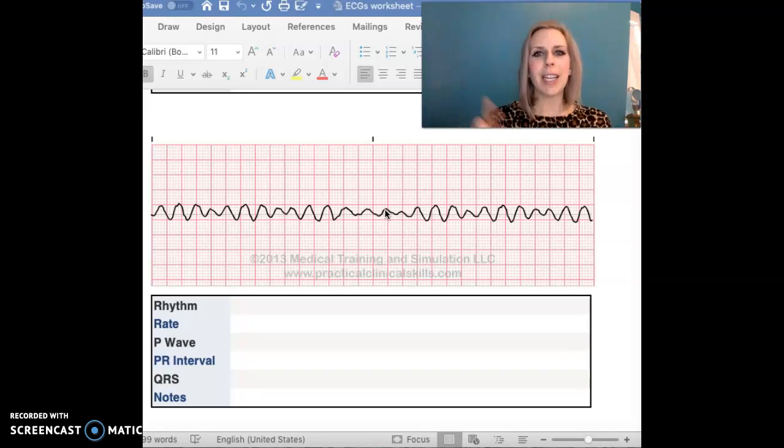The EKG looks like it has a wavy line. Now the ventricle is having much higher marking on our ECG. So we're going to assume that this is ventricular, and we're going to assume that it's fibrillation because it's irregular. So this synchronization that has been lost is going to cause this irregular wavy pattern of ventricular fibrillation.